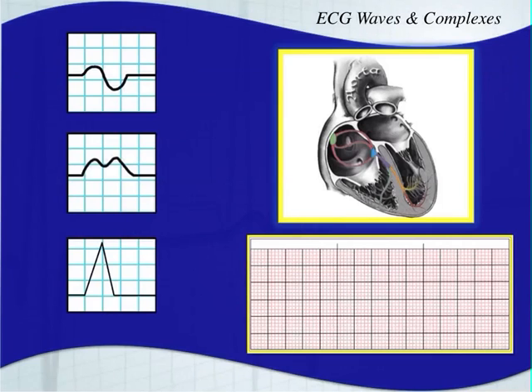Well, the P waves coming from atrial depolarization, I just want to kind of note that they can show up as many different types of waves. This first one that's biphasic here, all right, it could be normal, or it could also be a sign of left atrial enlargement. Okay, notice how it's biphasic.